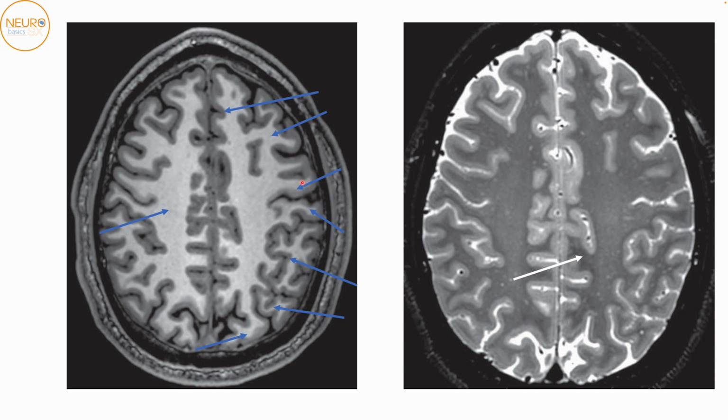A way to figure out what gyrus this would be is to again look for the thick and thin sign. Over here you can see this gyrus is quite thick and this is quite thin. So it helps you to identify that this is actually the motor cortex and this is the sensory cortex. So this is the precentral gyrus, this is the postcentral gyrus. Behind the postcentral gyrus, since this is not right at the top, this would likely be the inferior parietal lobule. The inferior parietal lobule would consist of, in this region, mostly the supramarginal gyrus. If you come slightly more posteriorly, this will be the angular gyrus over here.